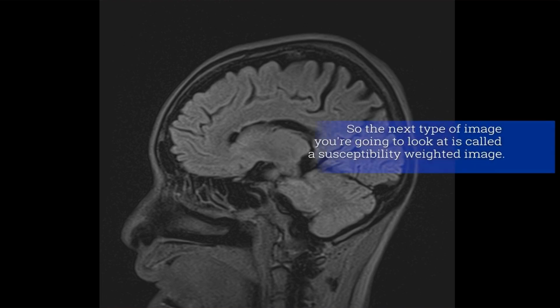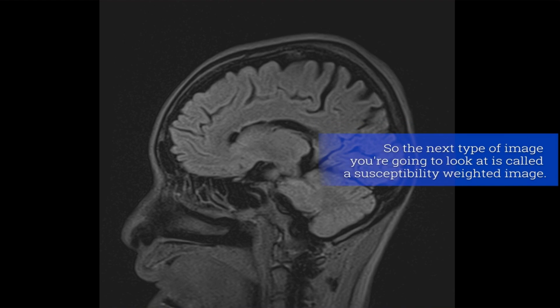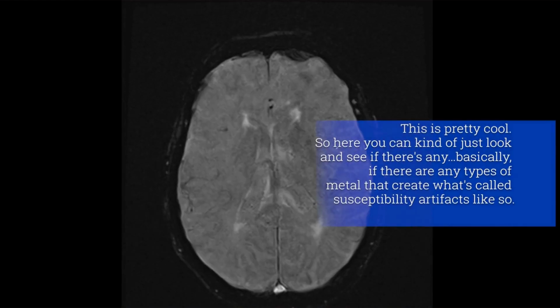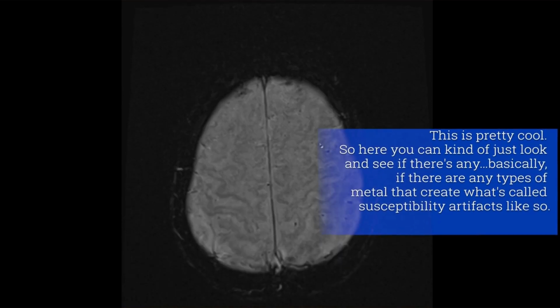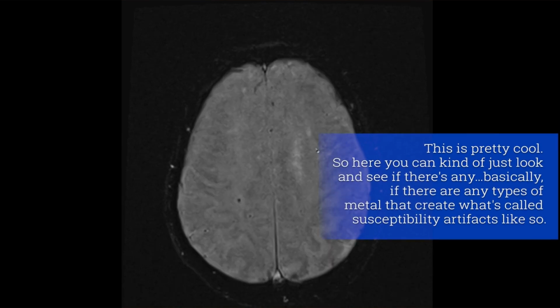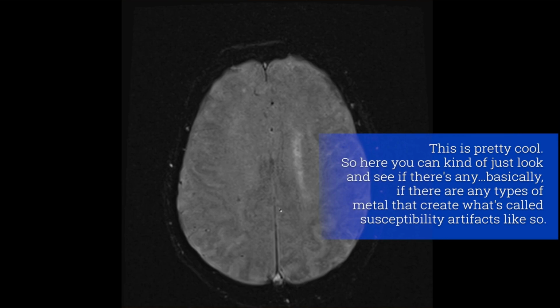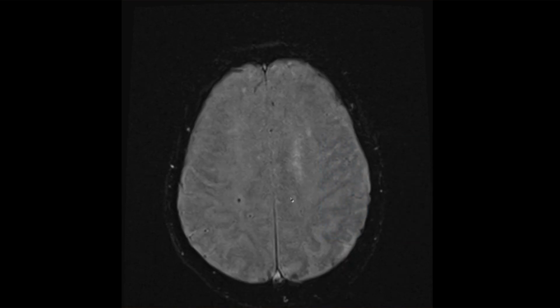Okay, great. So the next type of image we're going to look at is called a susceptibility weighted image. This is pretty cool. Basically, there are certain types of metal that create what's called susceptibility artifacts, and this sequence basically highlights those areas. They'll appear dark on susceptibility weighted imaging.